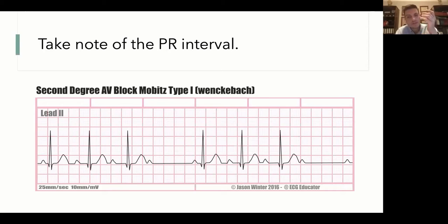Can someone let me know how we will express this? Yes, exactly. It's 4 to 3, and this will be constant, all right? Again, 1, 2, 3, 4, but only 3 QRSs and 1 is not present, okay? So I take it you all understand how this works.